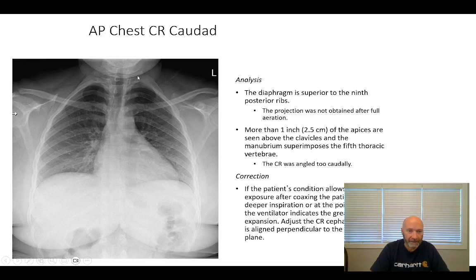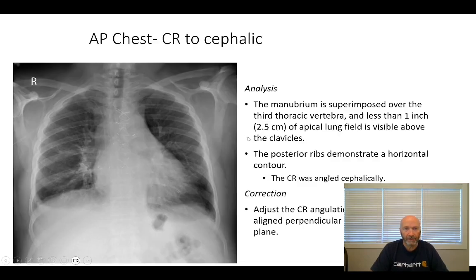We've got first, second, third, fourth. At least the fourth, possibly the fifth. It looks like 1, 2, 3, 4. Yeah, at least the fourth. Maybe a little bit further. Our angulation is too caudal on that one.